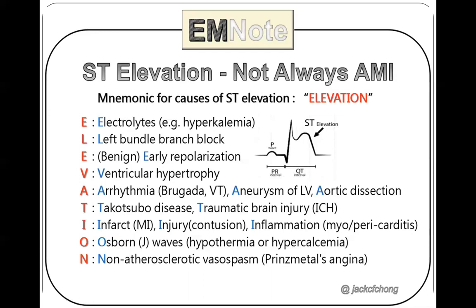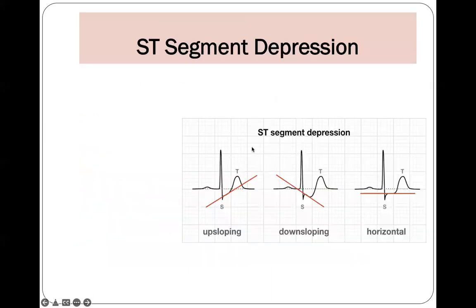So there is a wide variety of situations causing ST segment elevation, not always acute myocardial infarction. According to the clinical situation and the risk factors in the patient, you should individualize your decision or interpretation. Okay, then we will move to ST segment depression.